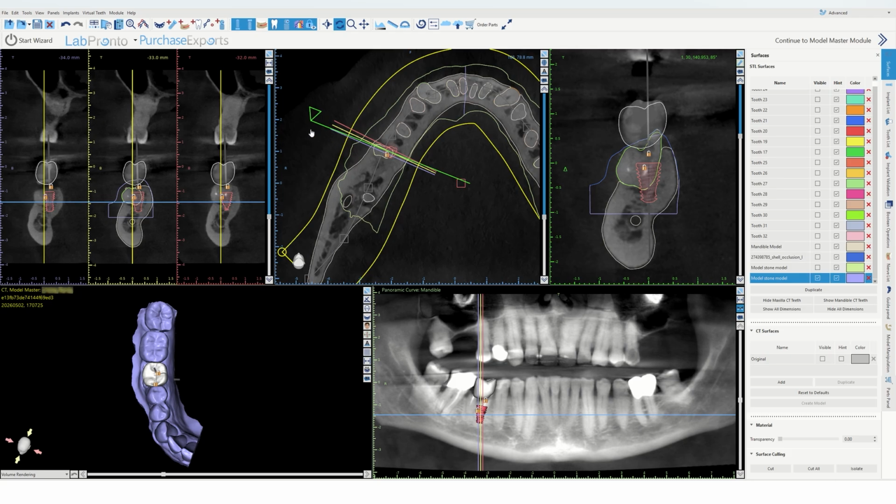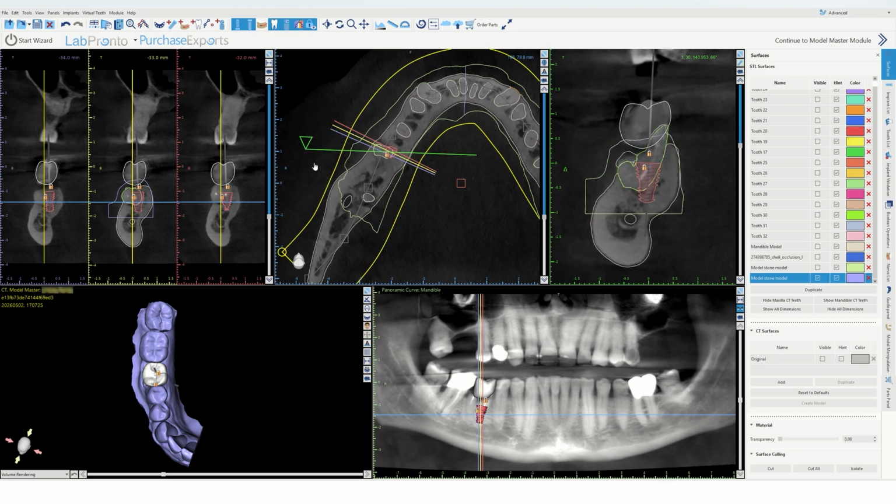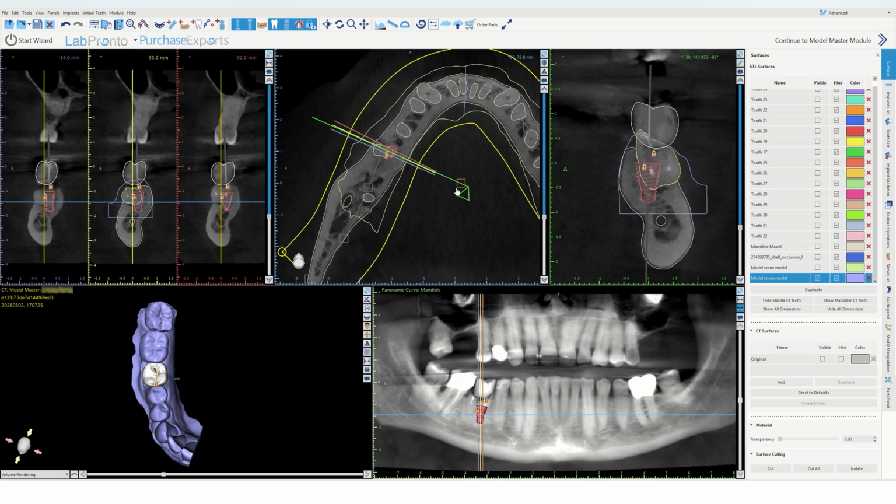you are always looking at the point, meaning if I'm a person standing here with my eyes pointed in this direction, all right, I'm standing here looking over here. On the left is the buccal. On the right is the lingual. The opposite would be this.